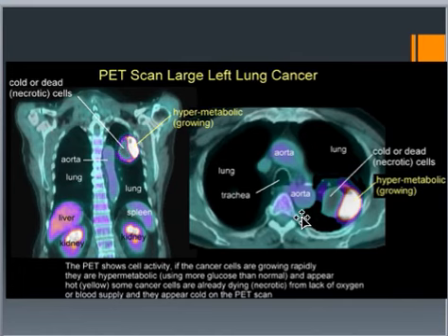So it gives you two nice views of that growth, and you can see where it's still growing and where it's dead. This is nice for physicians to be able to go in and really get a plan of what's going on. Is this tumor still growing? Is it going to get bigger? Is it going to change? And it'll help them in performing surgery as well.